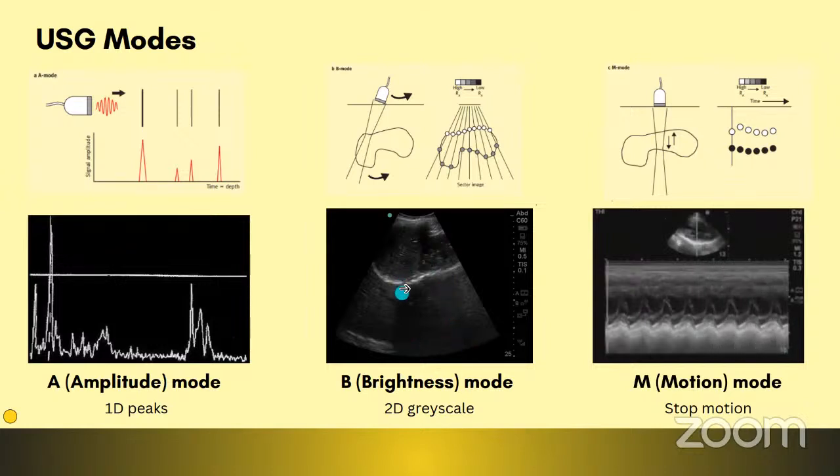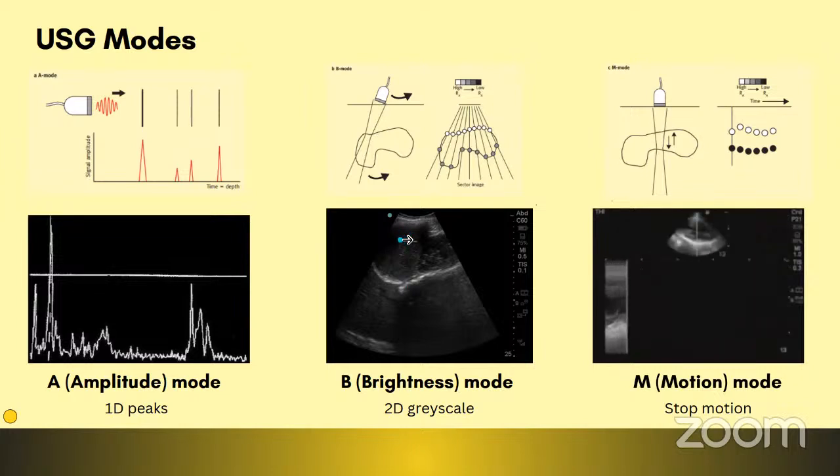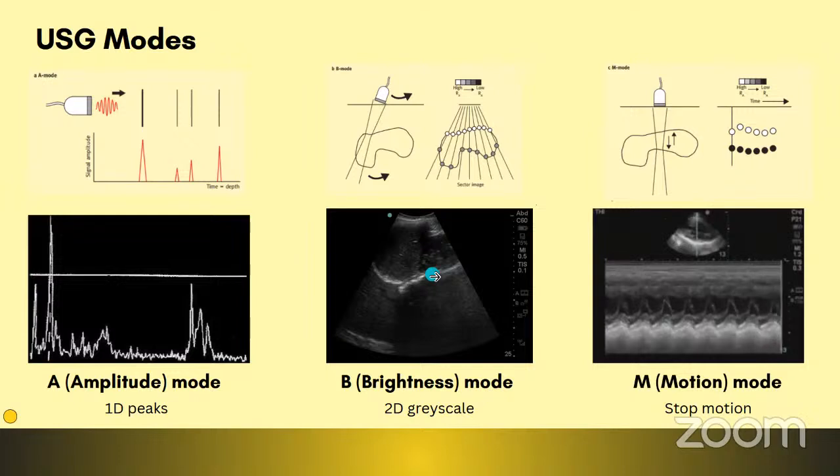I have taken an example image. This is an example image of a liver followed by the right kidney. So just a simple piece of information for you here.